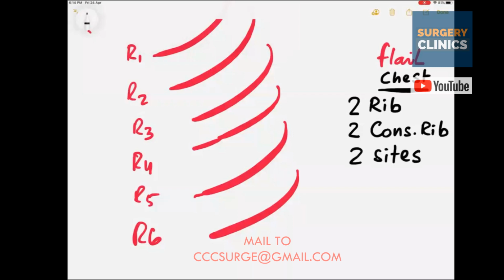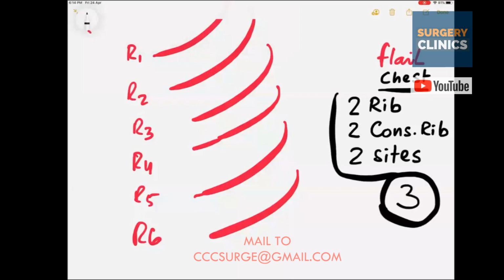So remember, there are 3 points, but 2 ribs at least. That means if this is fracture number 1, this is fracture number 2, this is fracture number 3, will you consider this to be a flail chest? The answer is no, sir. We don't consider this to be a flail chest. So what is a flail chest, sir?